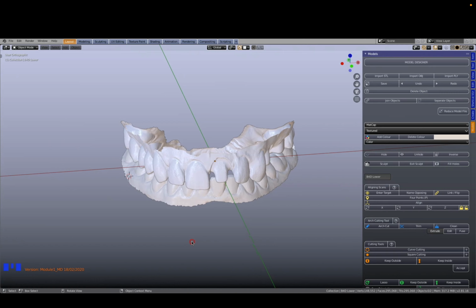While this tutorial features the latest Model Designer menu, some of the other tutorials display a menu from a previous Model Designer version. There are subtle differences with features which have been upgraded, however these will be pointed out to you. The basic functionality of the menus remain the same. We recommend you follow all the tutorials in sequence for a deeper understanding of the digital designing process.